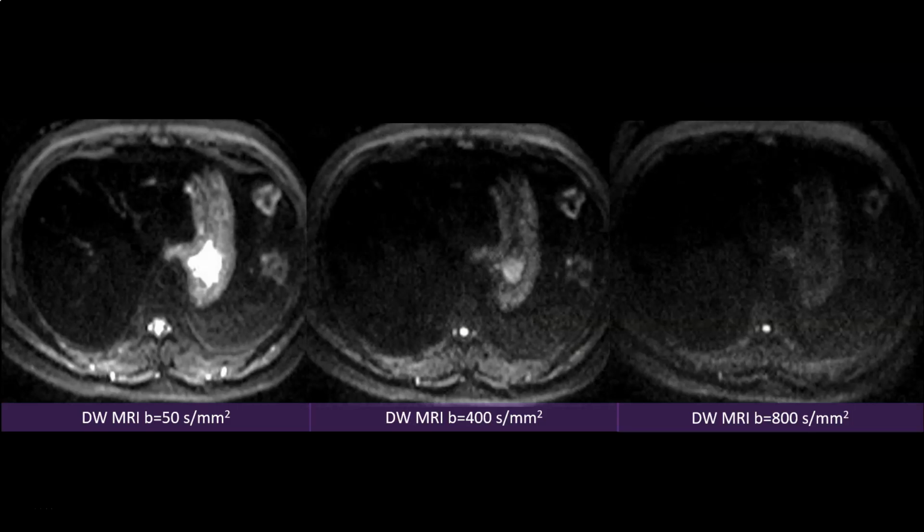This is the diffusion weighted image in our patient, and in fact it has clinched the diagnosis. Based on this image, we can conclude that we are dealing with combined fatty liver and iron overload. Someone may object, saying, how can such ugly and technically poor images be useful for diagnosis? The answer is that these are not ugly images and they are not technically poor.